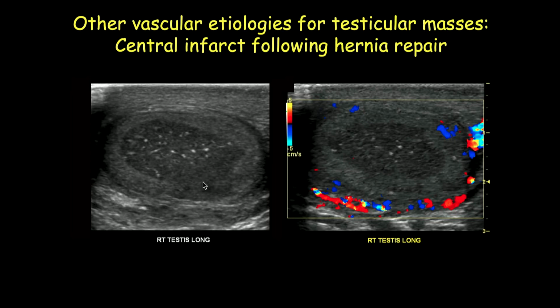He really tightened down the inguinal ring so that the bowel and the properitoneal fat didn't go down there, but he kind of overdid it a bunch of the time. This is a known complication of hernia repair. You tighten down so much that you prevent the hernias from going, but you kill the testicular artery. So I've got like 10 cases courtesy of him.